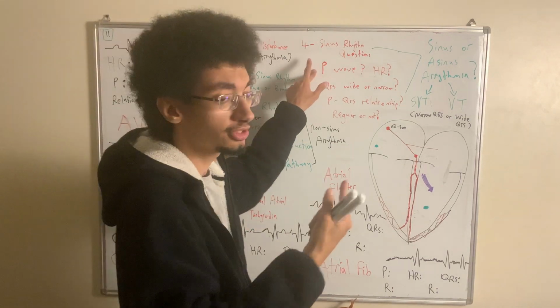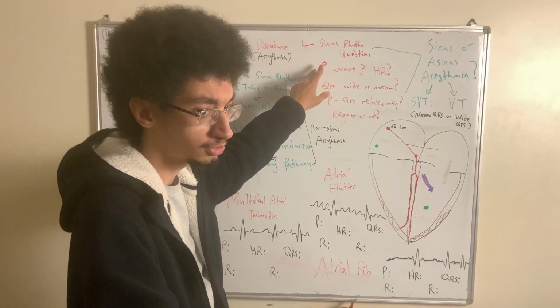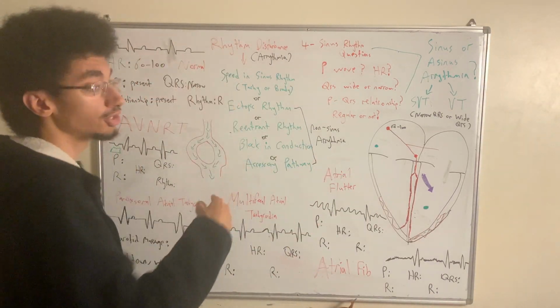So you want to ask yourself, is there a P wave present or not? And if it is present, how many are there? So that's the first question you ask yourself.